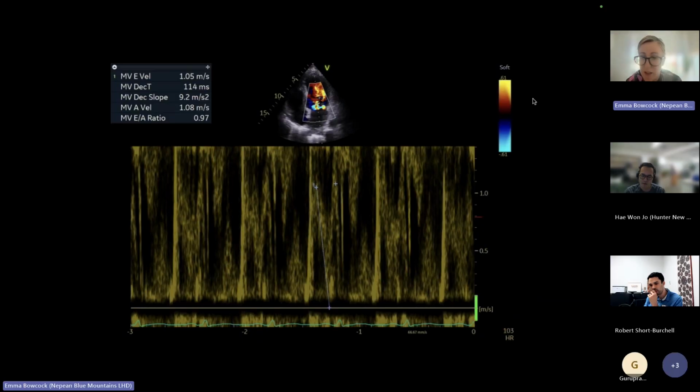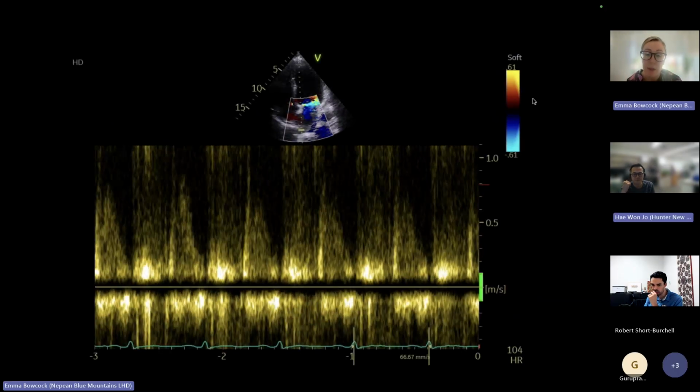There's fusion of E and A. You don't know where the peak of that E wave really is. It's a bit of a poor trace. You beautifully said, because it's eccentric, I wouldn't trust that there isn't any systolic flow reversal. It still doesn't mean that there's not severe MR, which was very nice. And then it's really hard to do the quantitative measures on TTE based on the images that you have, because you can't really see the components of the jet very well. The mechanism, and the fact that the LV is small, not remodeled, and hyperdynamic, all support it being acute.